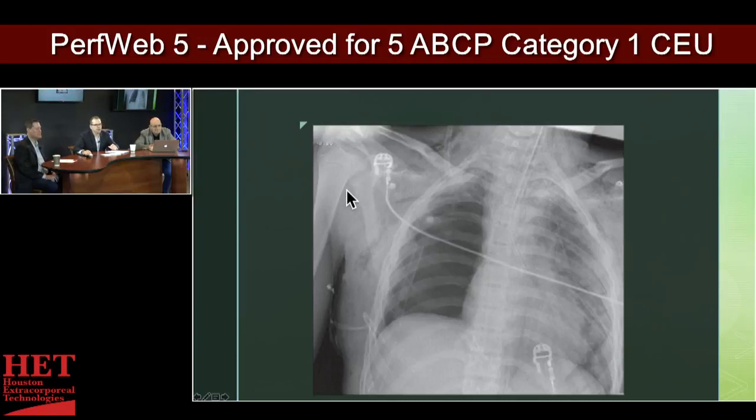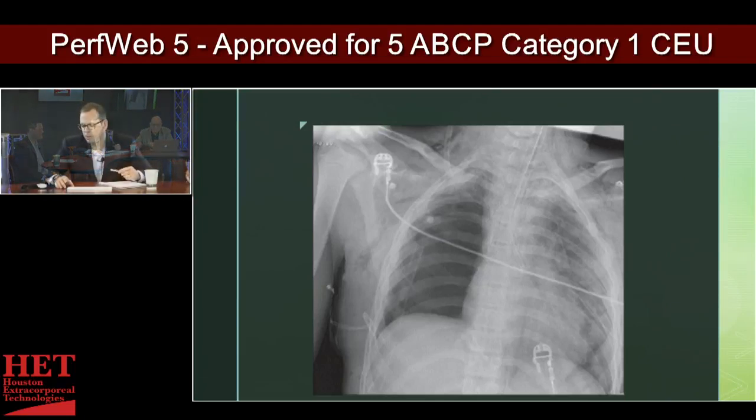So a lot of different findings on this one. But if you go in that stepwise manner, you can start to put the picture together. You can imagine if you're a radiologist sitting there in a little dark room with your cup of coffee and your mood lighting, looking at X-rays. You can start to figure out what's going on with this patient just by looking at the X-ray, going through these steps every time the same way.